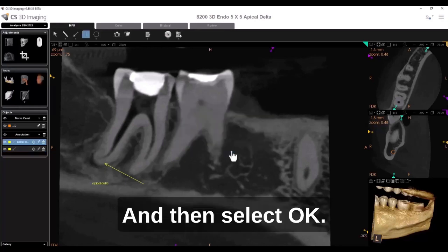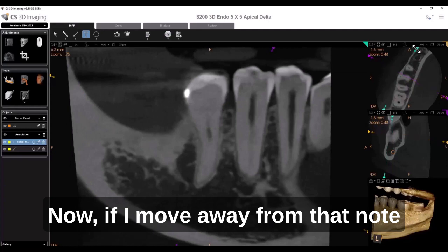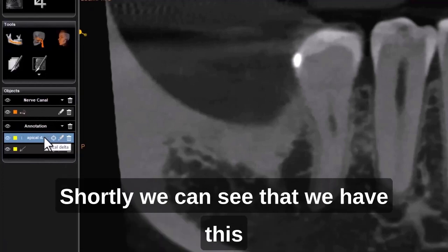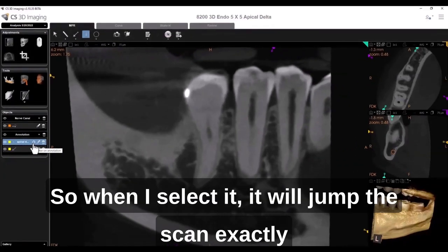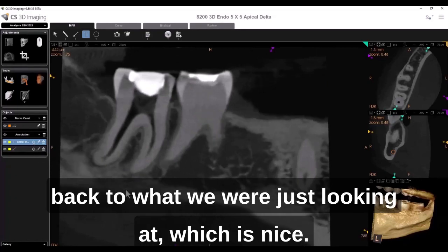and then select OK. Now, if I move away from that note and that arrow, we can see here in our object bar, which I'll go through more shortly, that we have this little center on annotation, which is similar to center on the implant, center on the crown. So when I select it, it will jump the scan exactly back to what we were just looking at, which is nice. So it's a nice little feature.